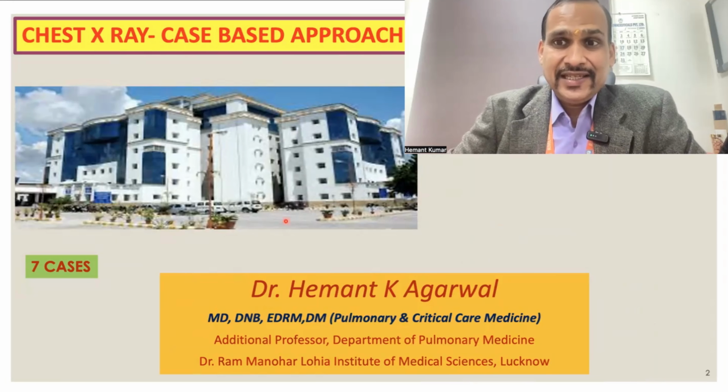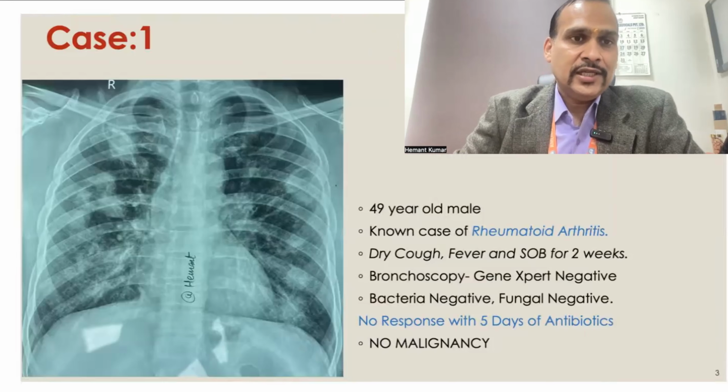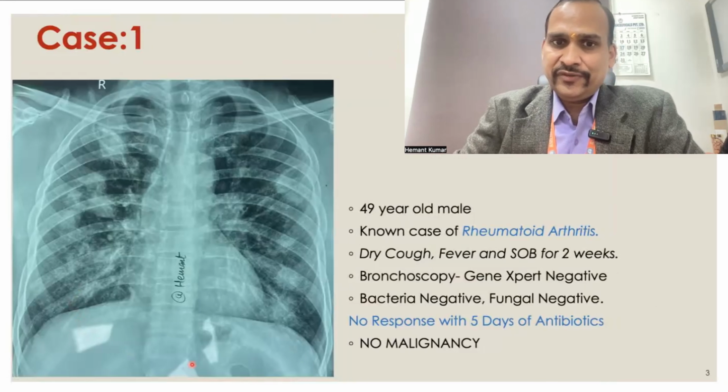Hello friends, in this series of chest X-ray, we will discuss a few interesting cases based on radiology, especially chest X-ray. So we will discuss 7 cases and we will see its radiology. So let's see our case number 1.